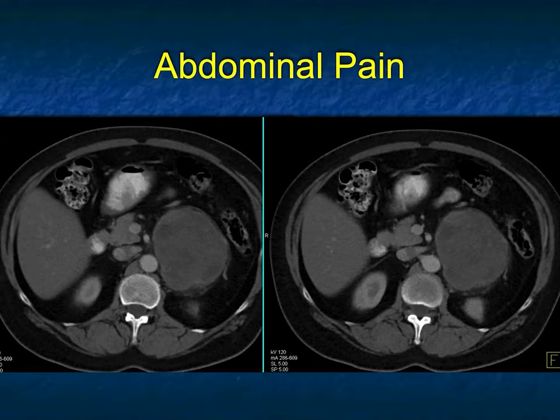They're not always vascular. You could think about almost any tumor that bled. But the first thing I would think of was a primary adrenal cortical carcinoma. They're often large, they can be necrotic, they can be slightly vascular, they can have calcifications occasionally, but they can present when they're large. Typically the patients have no hormonal abnormalities. The most common presentation, of course, is Cushing's, and those tumors are picked up when they're smaller because of the clinical presentation.